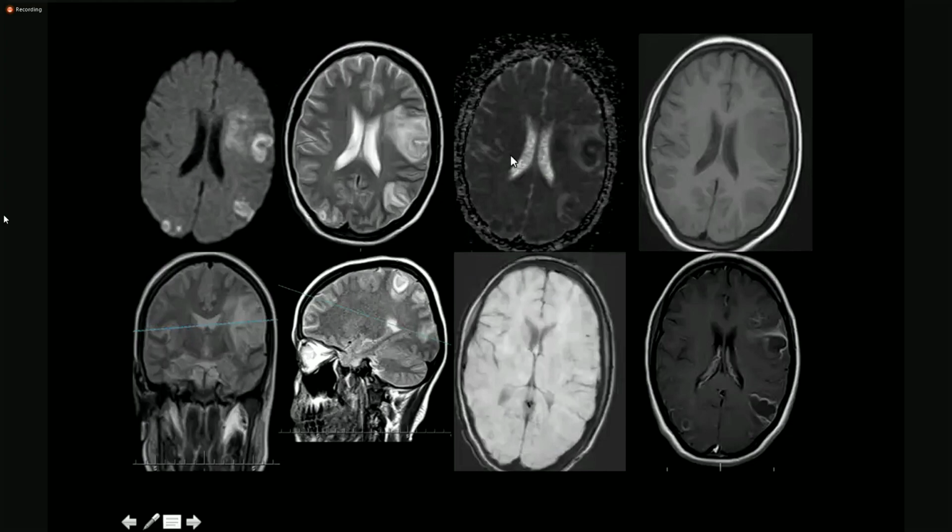This is ADC. ये जरा आगे पीछे लगते हैं. DWI, ADC, T2, T1, coronal FLAIR. ठीक है. ये भी T2 है, ये susceptibility है, और ये हमारे पास T1 post contrast है. ऊपर नीचे प्लेन और पोस्ट कॉन्ट्रास्ट है. जल्दी से 10 सेकंड्स में अपनी फाइंडिंग्स बता दें.